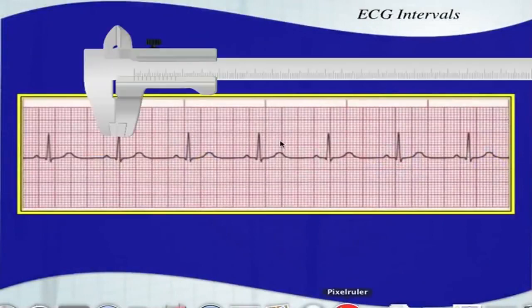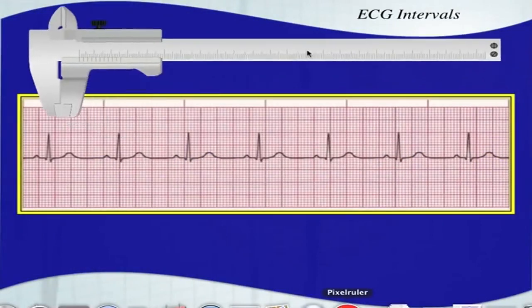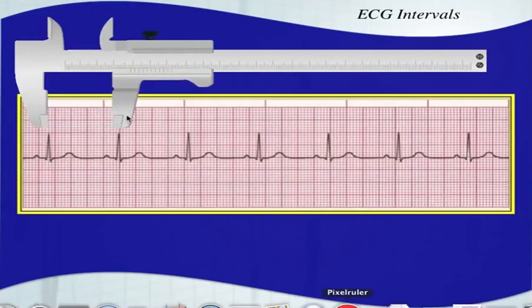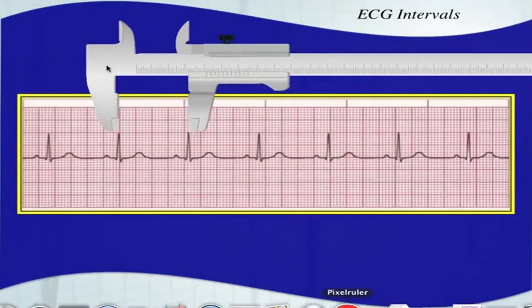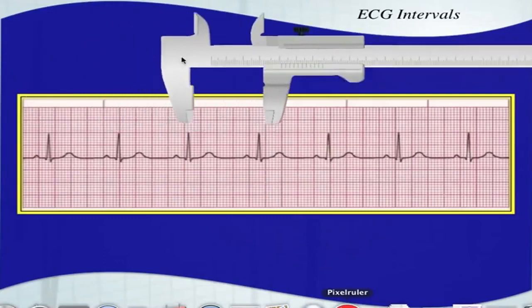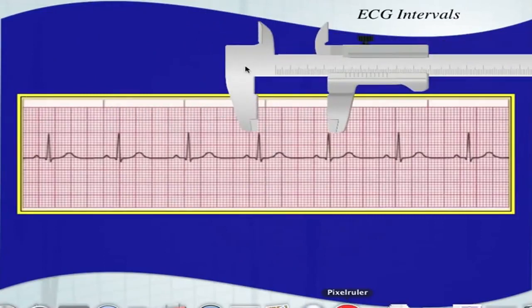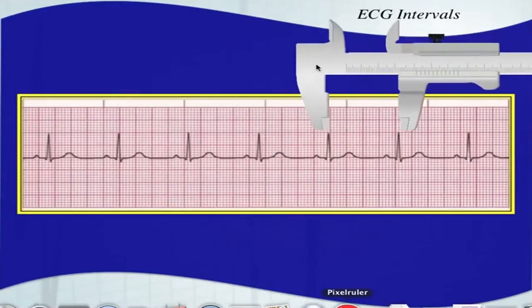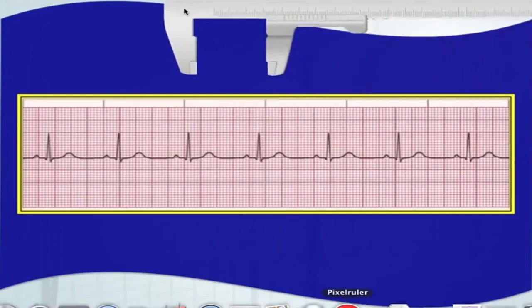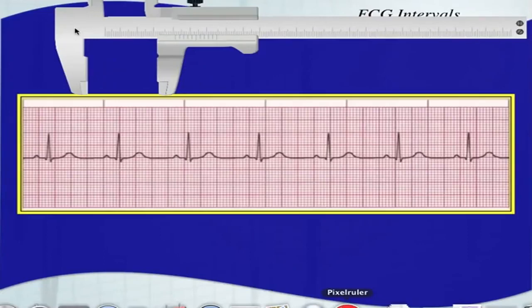And there's another way to do it. A very easy way would be to take another EKG strip piece of paper and just measure or draw a line from the first QRS complex to the next, and then you would pick up that piece of paper and measure it out comparing to the next one. So you can see with these calipers that I'm using that this rhythm stays very regular. That R to R interval stays very regular throughout. So this rhythm would be considered regularly regular.